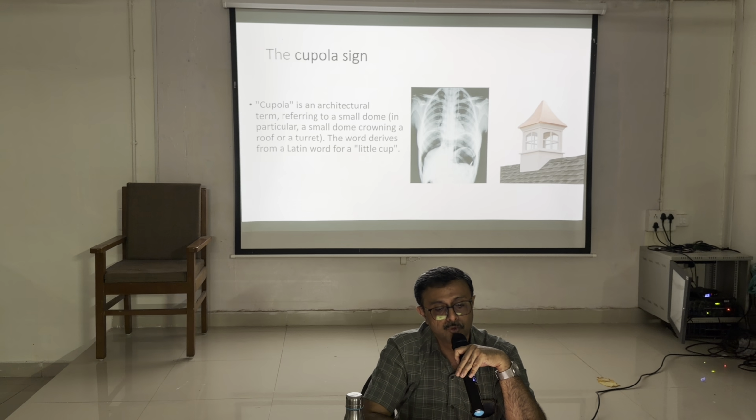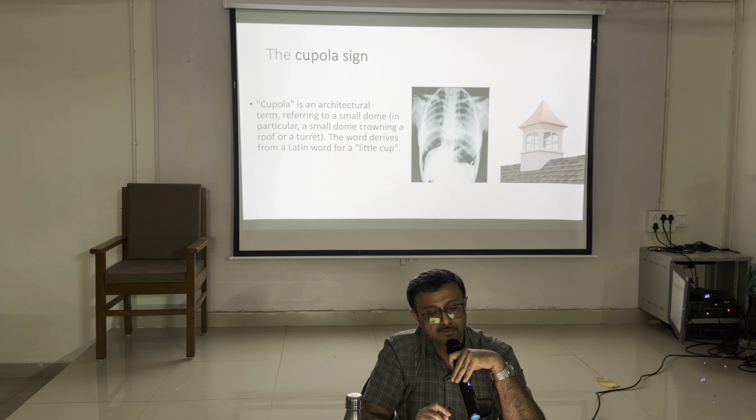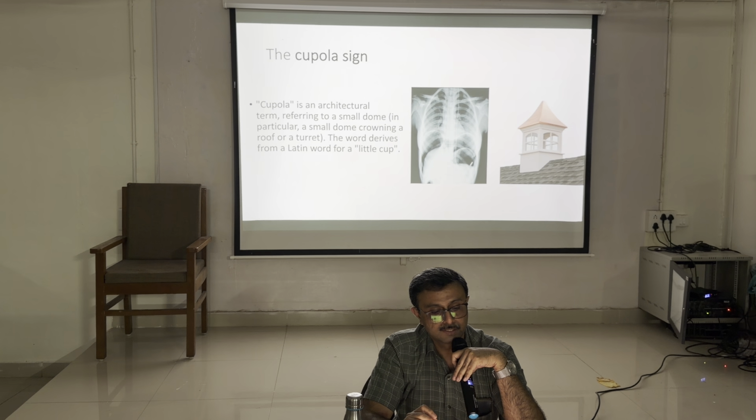That is called cupola sign. What is cupola? It is an architectural term referring to a small dome, in particular a small dome crowning the roof of a tower. The word derives from a Latin word for little cup.